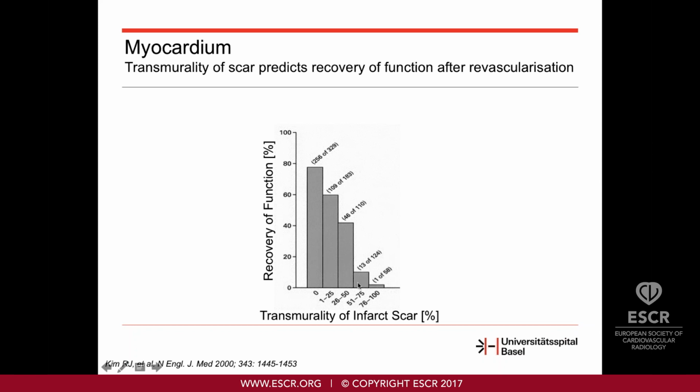And this is important for the decision whether we revascularize this patient or not. In this case, we would revascularize infarcted myocardium, so there would be no benefit for the patient. This has been shown in this study. Here you see recovery of function plotted over transmurality of infarct scar.